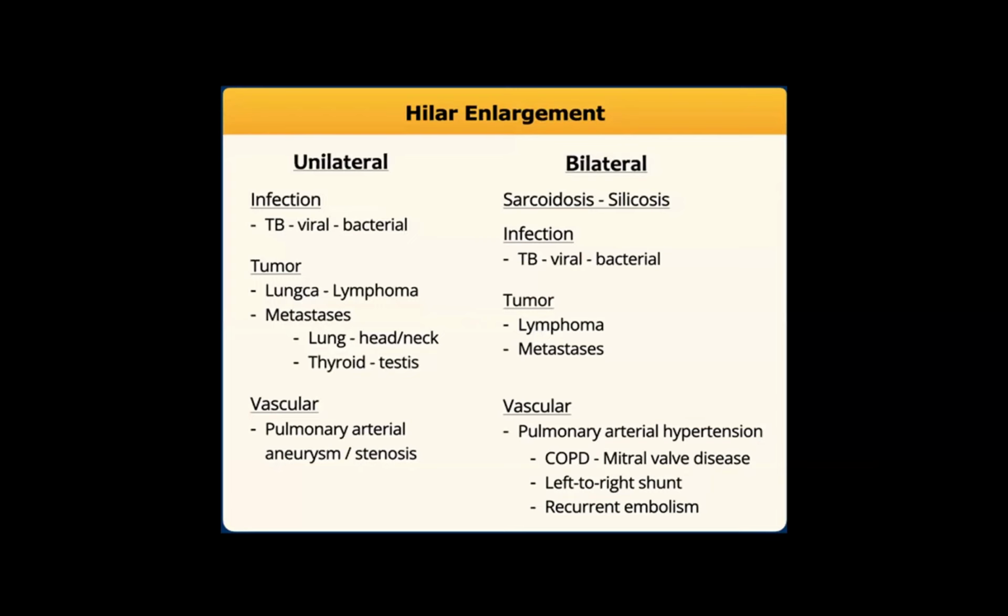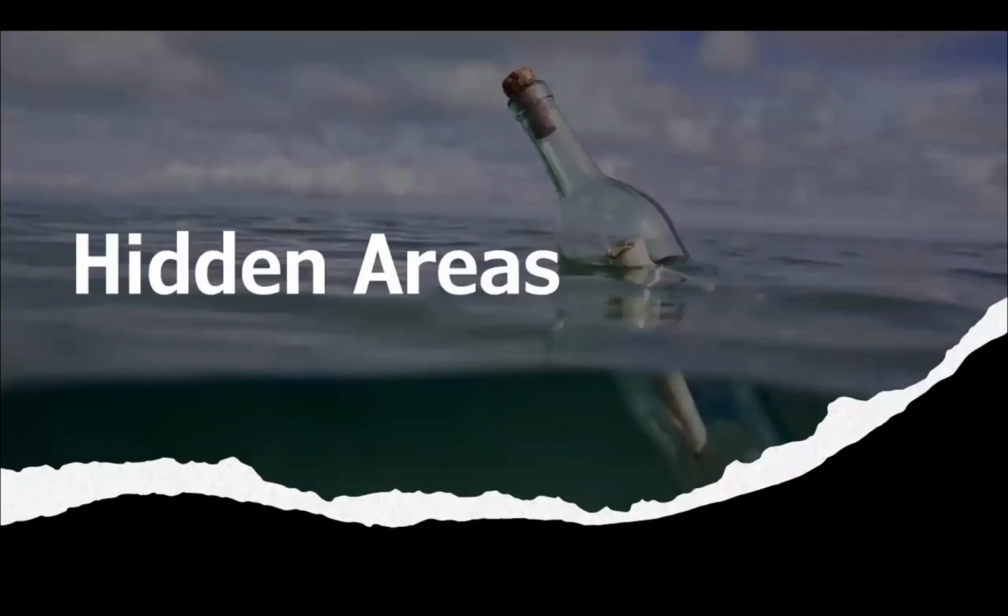These are the reasons and the differential diagnoses for hilar enlargement. Tumors, most importantly, lymph nodes with all the differentials, primary and metastatic. It could be in the setting of infection, obviously TB. It could be in the setting of granulomatous diseases like sarcoidosis, particularly if it's bilateral with right paratracheal, and it could be vascular enlargement and enlarged pulmonary arteries.